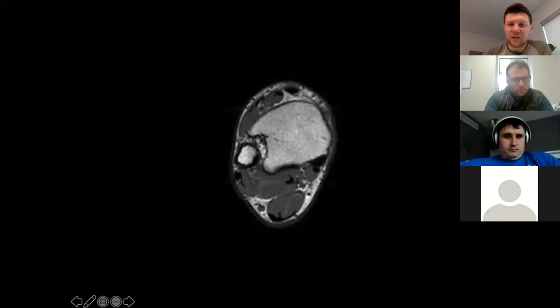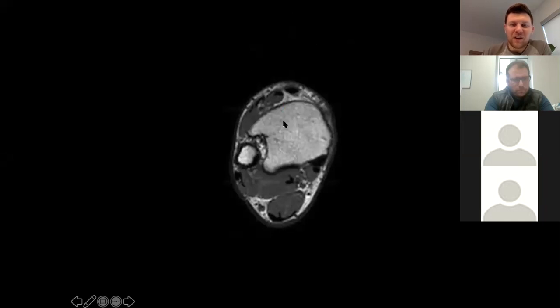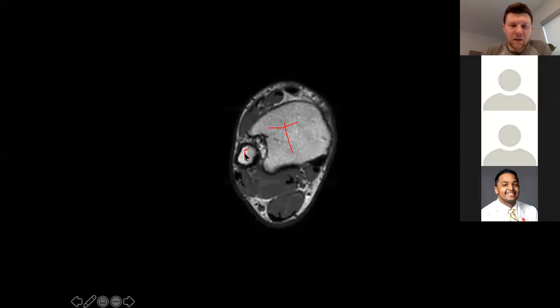Everything is pretty much answered. There's only going to be a few other things that we're going to talk about. I can do it. Okay. So starting off with the bones, what bone is this? Still the tibia. Good. And then your fibula is right here. And we went through everything else as far as tendons. Nothing else has really changed except you start to see everything separate out.